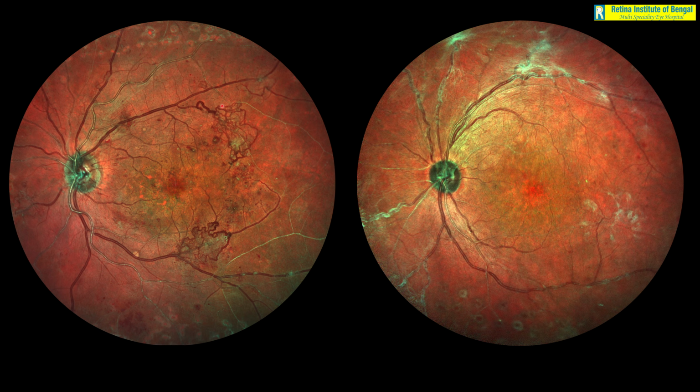Second, it will also tell you whether the new vessels are fibrous, as in this right hand image, or they are highly vascularized. Because we know a highly vascularized new vessel like this can bleed anytime. If you have, however, a fibrous new vessel like this, probably it has stabilized. So this is obviously very useful. And this is also useful when we are monitoring a new vessel. So if we are treating a new vessel, if it was at the beginning vascular like this, we would want it to become fibrous like this.